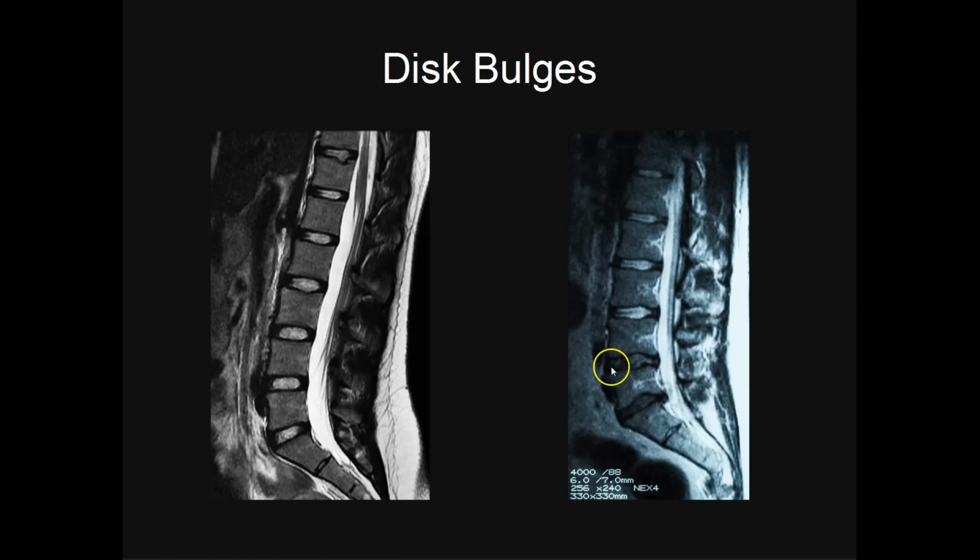So looking at this, we can tell that the force is going this way, the nucleus is looking out this way, so we know that this side of the spine here compresses, i.e. gets shortened, which in this case would mean that the spine is being compressed or flexed. So if you imagine like an arch coming in this way, we know this is what's causing this material here.